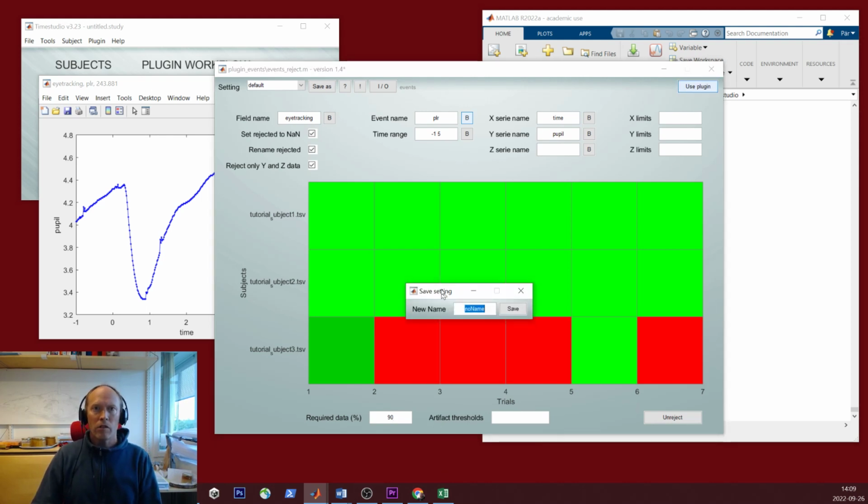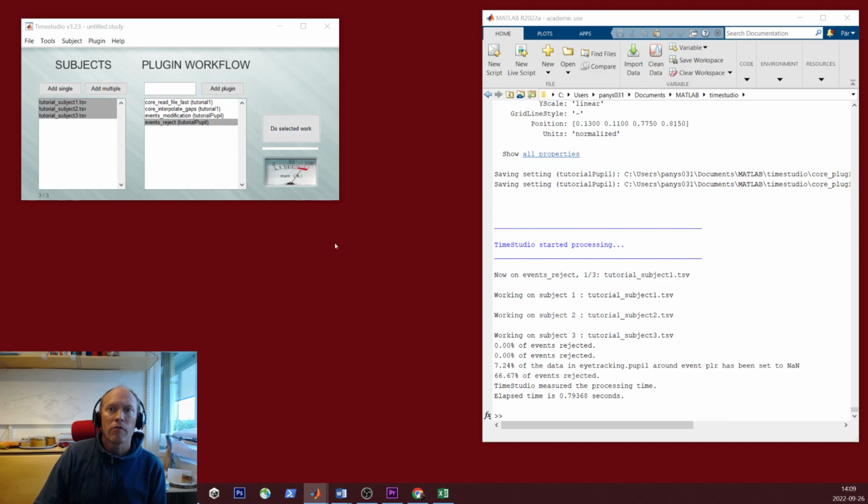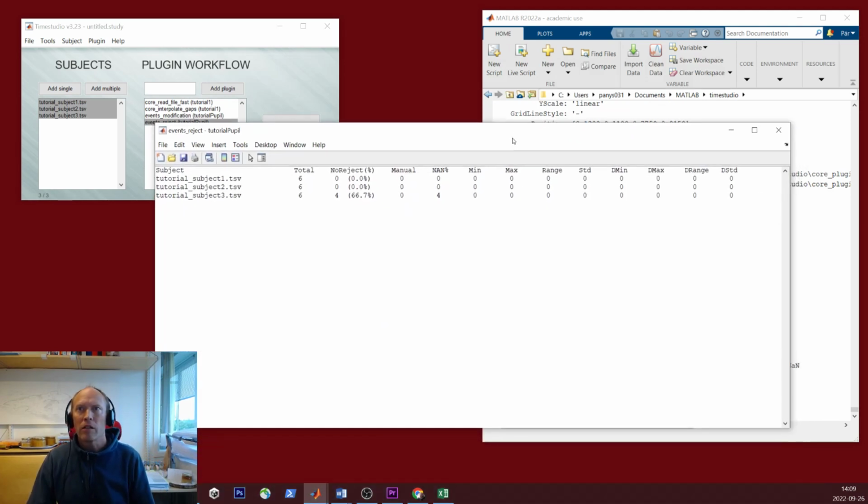I will save this setting and run it. We can now see that it rejected 4 trials out of 6 for the 3rd participant.